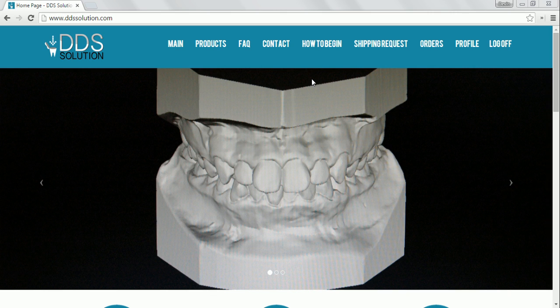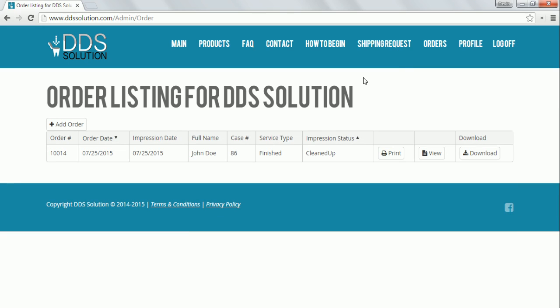So starting from the DDS solution homepage, I've already logged into my previously created account. I'm going to click the Orders tab. Once I've clicked the Orders tab, this is going to load my list of orders and cases that I've submitted, and this is the case that we previously submitted in part 1 of the tutorial, and you'll notice that now the impression status has been updated to cleaned up, meaning that this case has been finished, and I've also received an email notification letting me know that.